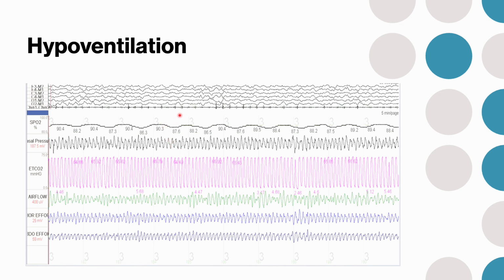There's not a snore mic, but there are these little things right here. That's the chin. And I don't see a heartbeat. That could be the heartbeat. It's hard to tell. That could be snoring too. But I don't think they quite line up with that. You have to line these things up. That looks more like a heartbeat. I'm showing you all the ways that you can use all the data that you get to qualify if something's real or not. You want to make sure it's real.